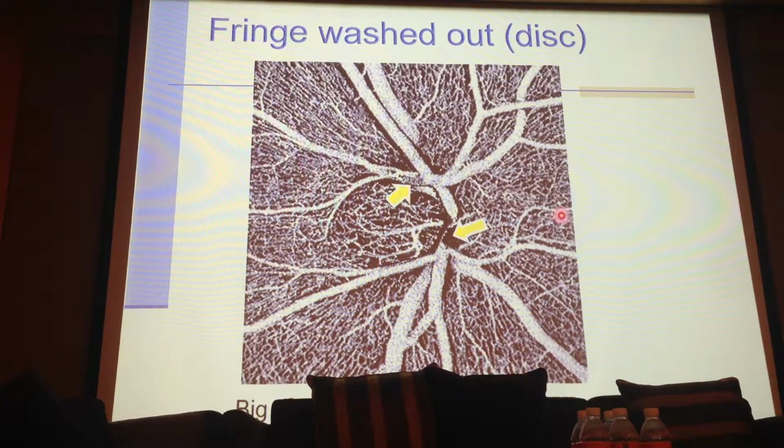Okay, here's some other factor that needs our attention. The optic nerve head, and you see some of the area is relatively dark in big vessels. Does it ring a bell to you? Dr. N showed a case of the cornea, right? I think that's perhaps the same story. In some of the cases like this, perhaps it is because the velocity of the flow is too strong, so the signal gets saturated.